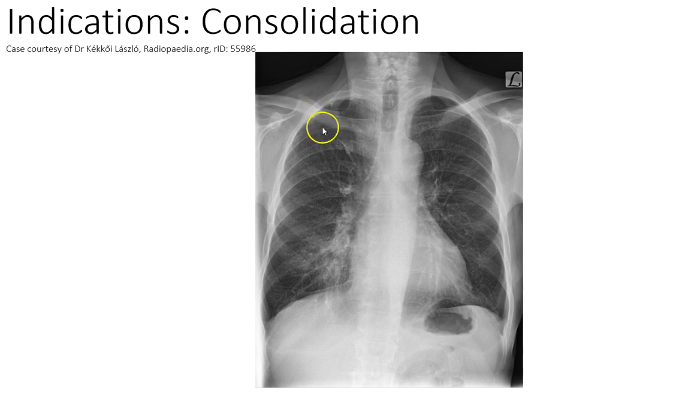But I wonder if it might be indicating some fibrosis or some fluid, and this would perhaps be in the fissure, the joins between the different segments of the lungs. And that's just standing out a little bit thicker than I might have expected it. I wouldn't normally expect to be able to see that. It doesn't align with any other anatomy that I can think of, other than the separation between the different lobes, segments of the upper lobe of the lung.